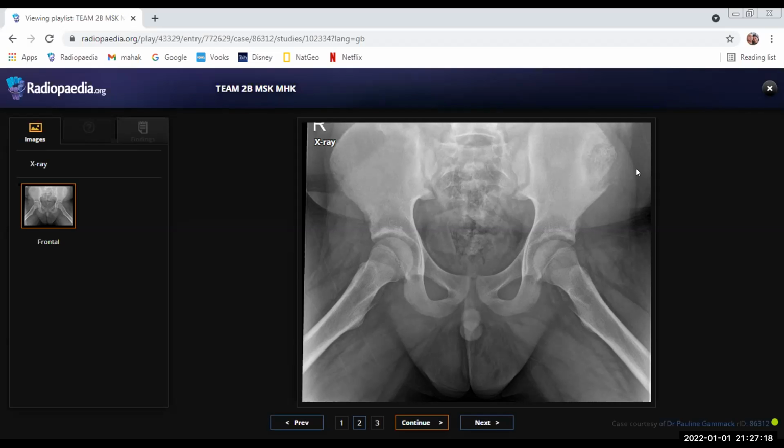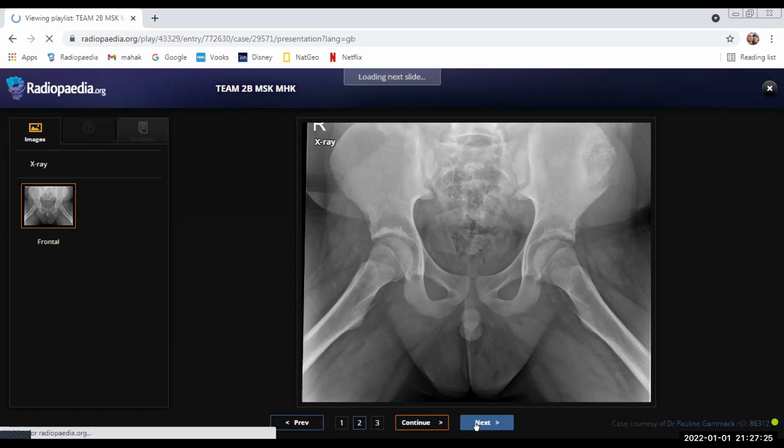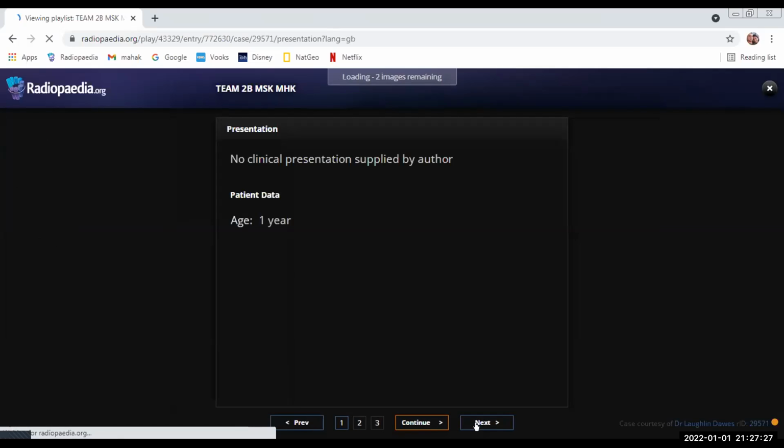This was sort of an edge of film case. Please turn to your next case. Okay.